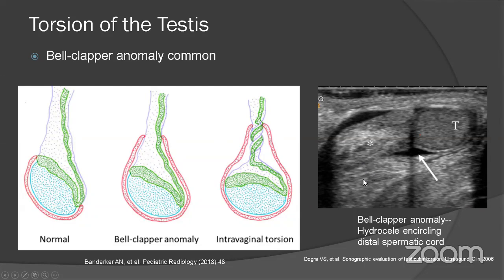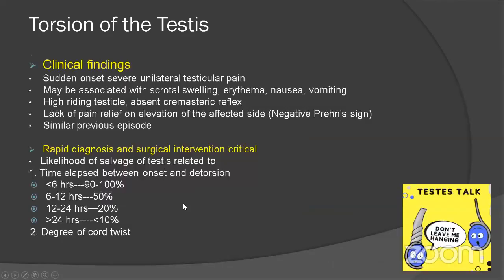Of course, I also talked about the location of the mediastinum testis, the echogenic line. If it is medial in location, you know it's abnormal fixation of the testicle. Also note how, when the testicle gets torsed, it becomes more horizontal in position rather than its normal longitudinal position.